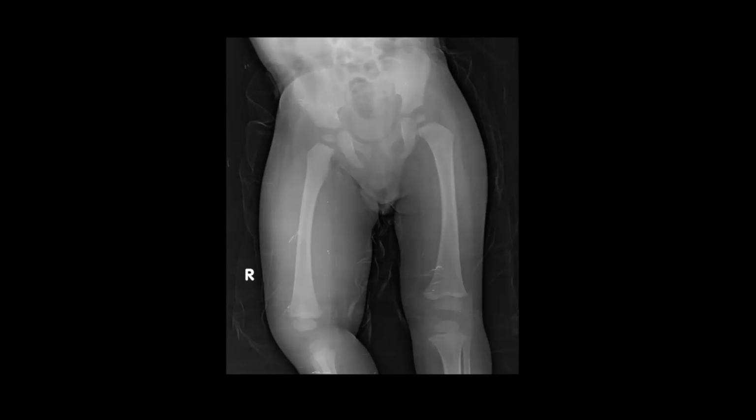The soft tissues on the right side appear more dense, predominantly along the lateral aspect of the right femur. There are a few radiopaque densities. These densities look artifactual, but there is a soft tissue increased density producing a bulge, so I would like to evaluate this further with MRI.